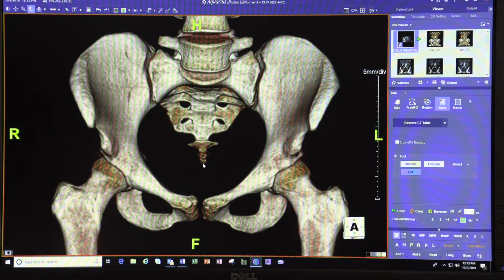Now in this case, this happens to be about 4 centimeters, which is good. There is no anterior pelvic tilt where the sacrum is high up, or posterior pelvic tilt where the sacrum is lower down. So this is adequate pelvic tilt. Next thing you want to look at is whether the pubic symphysis is lined up with the sacrococcygeal junction. If it does, then there is no side-to-side rotation. So we looked at the sagittal rotation in the first place by this distance. Now we look at side-to-side rotation. It looks like there is no side-to-side rotation, so that's good.